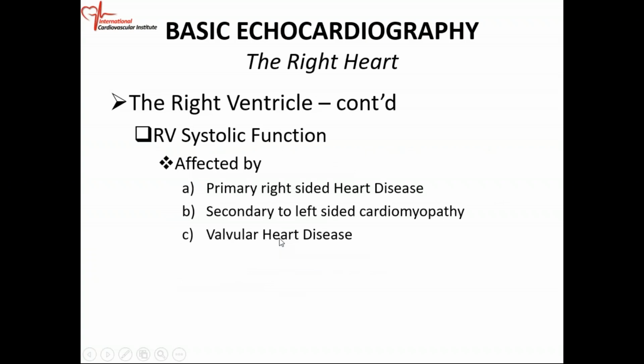Okay. All right. So how do we assess RV systolic function? The size of the RV is important, and assessing RV systolic function is also very important.